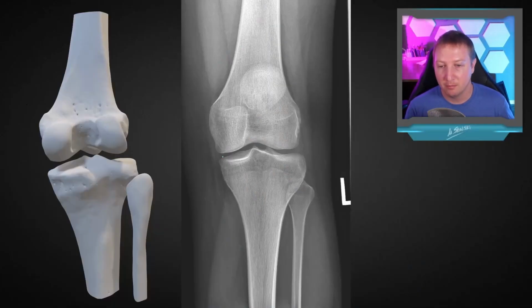So the medial tibial plateau and the lateral tibial plateau do project a bit differently. You can see that this tibial plateau on the lateral side, we see nice and tangentially across the surface of it, but we actually see this one a bit obliquely. So these are a little bit tilted relative to one another. They're not going to be projected quite the same way because they're not at the same angle. And so that's just something you may observe.